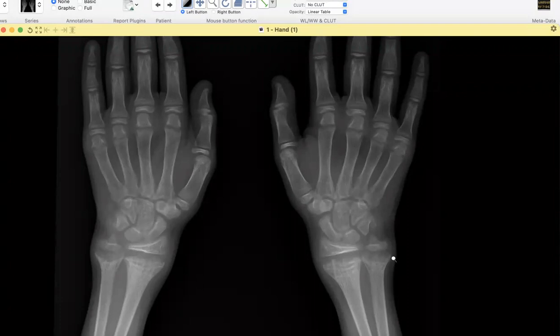Okay. So I feel most closely rickets will resemble scurvy, and both of them involve the long bones, basically the knee joints, wrist joints, not the small joints. Other thing is, over here we call it fraying. And the long differential that we have is for metaphyseal flaring, which is the Erlenmeyer flask deformity.